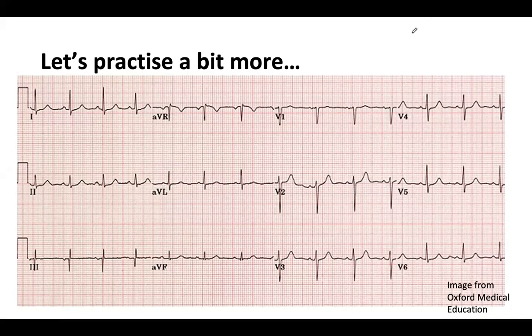I think because of time, I'll just give you the answers. Someone has said rate of 84. Good. So that's fine. So we'll go through rate.